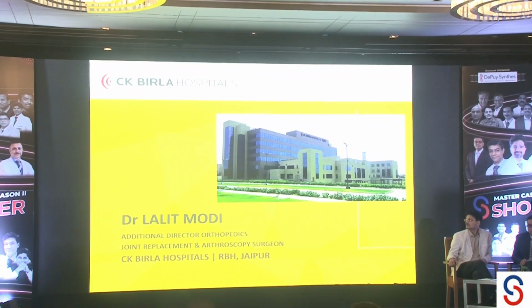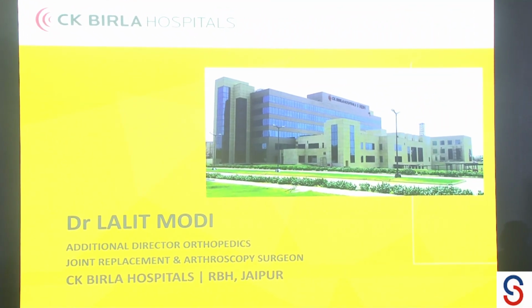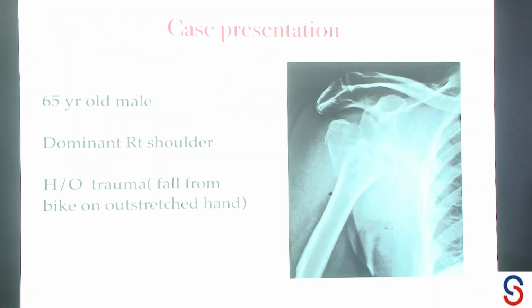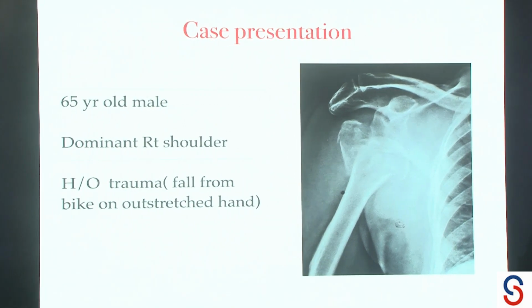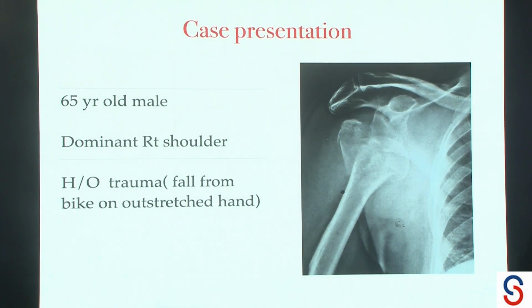Myself Dr. Lalit Modi, and I'm presenting one trauma case. This is the X-ray of a 65-year-old male who has a history of trauma. He had a fall from a bike and got into an accident. This is the X-ray of his right side, and he is right-side dominant in the shoulder.